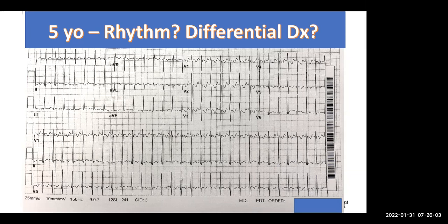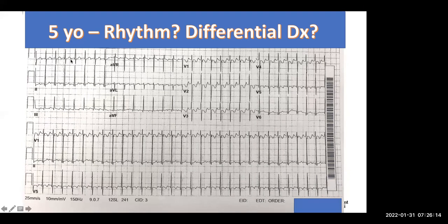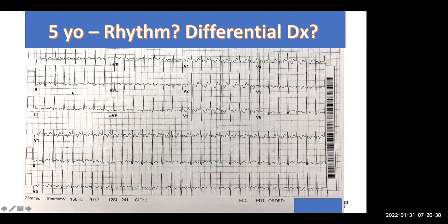If the ones that I think can lead one are P waves right after the T waves, I think those are inverted. You're referring to this. Yeah. And then if I follow that suit, then it is inverted in aVF also. And II is inverted, III is inverted. I would say it's like a low atrial rhythm, or coming from an ectopic focus, and considering it's tachycardia, I would call it EAT.